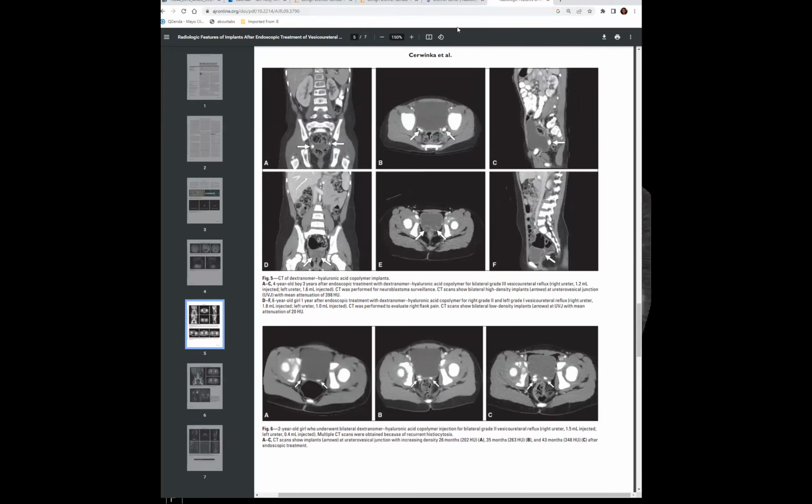Yes, I think that's probably what it does. And this patient was in her 20s, so the procedure was done when she was much younger. Very cool. Pitfall for a stone.